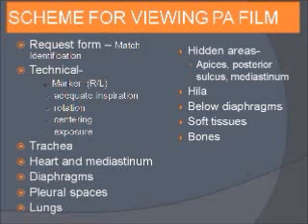After commenting on the inspiration, now we should see whether the patient was standing evenly or not. There should not be any rotation because rotation will make us commit a wrong diagnosis. I will tell how to see rotation. Then we should see whether the centering was proper or not: whether both costophrenic angles and both scapulae have been covered in the chest X-ray or not.